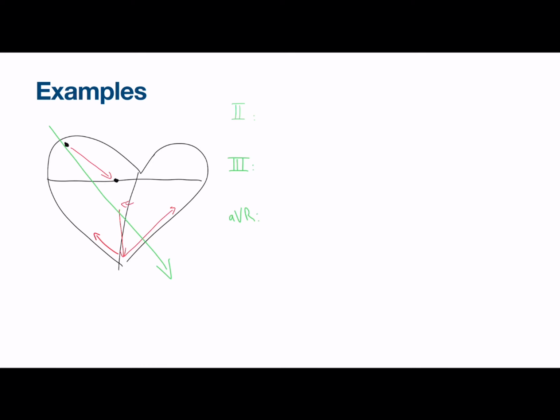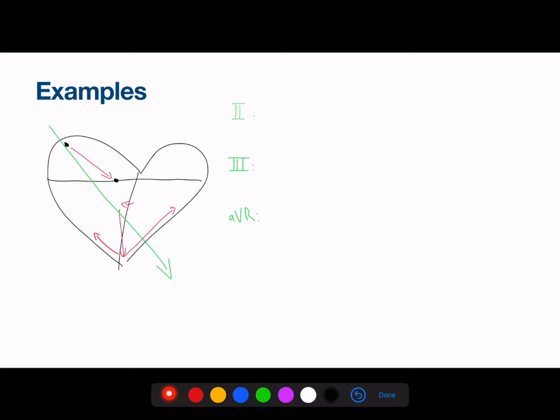Now I will explain how the different leads look like on the ECG and why. So in general, you know from the previous example, before the depolarization, of course, there's the isoelectric line because there are no action potentials.